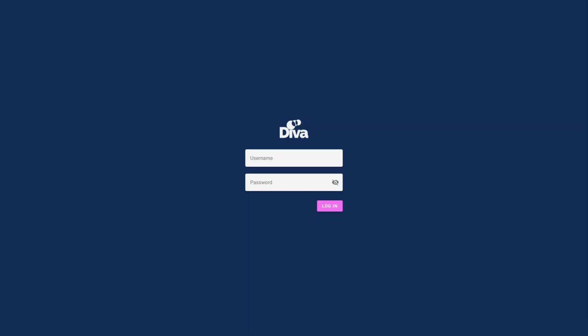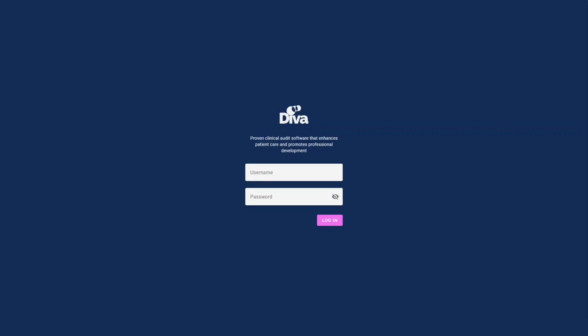Hi, I'm Jackson, and I'll be showing you how to enter data as an anesthetic user of DIVA. First, we'll log in using our usual network credentials.